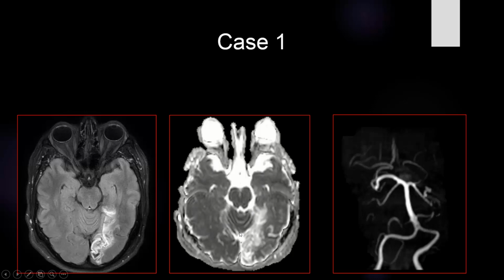In the diffusion weighted images, we can see that in the ADC map, the area is high in ADC. This confirms that the infarction is chronic. So the typical answer of this case is left PCA territory chronic infarction. We must say chronic, as the ADC map indicates that the lesion is chronic in nature.